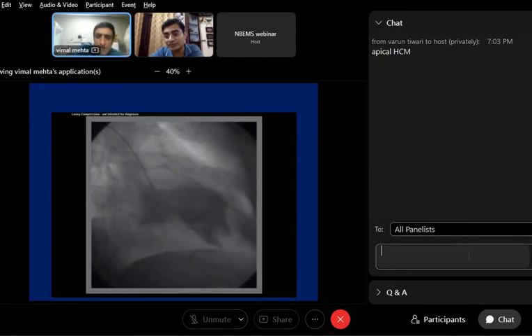See, an old thrombus will be a calcified thrombus. Likely calcified. Not in all cases, but in general, thrombi will ultimately calcify if they have been present for a long, long time. One person has written, I think, organized with mild calcium. Okay.